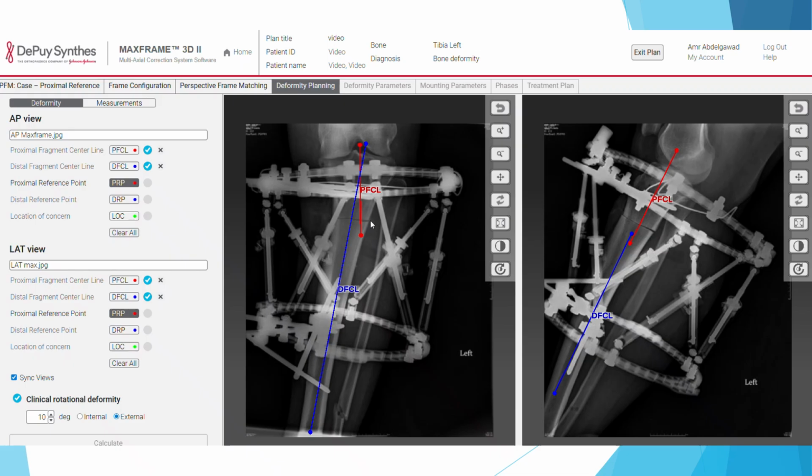So let's say that I pick the proximal at the osteotomy here, which is usually what we do at the fracture. We pick it at the fracture. I'm going to show you an example of a fracture, but this is not a fracture, this is a deformity. So we'll put here, immediately it gives you the line here. So we will pick it here. We will try to raise this slightly up so that it goes into here.